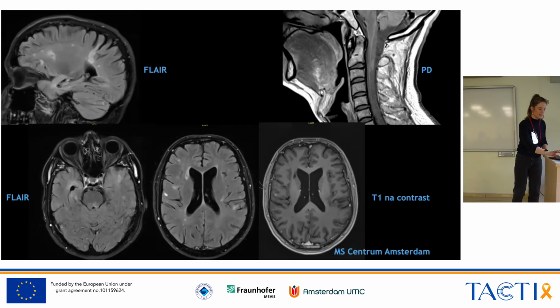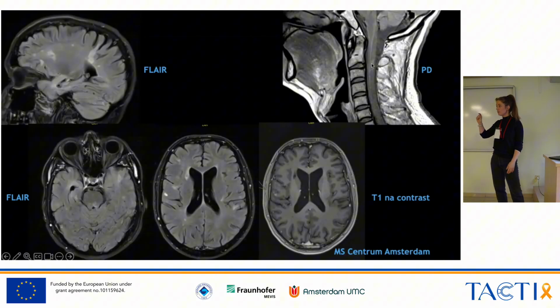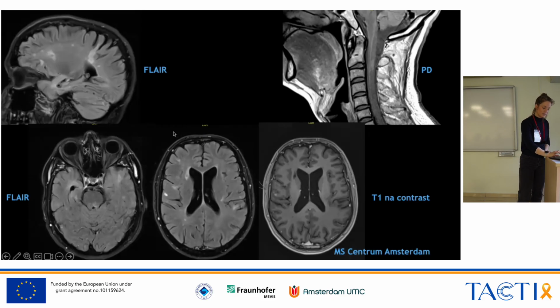Yeah, and you see a hyperintense lesion here. It's only one segment, so it's short, and that is typical of MS. If you see a long lesion, then you must think of the cousins. So cousin ADEM, cousin NMOSD, MOGAD. I think this is the most important one.